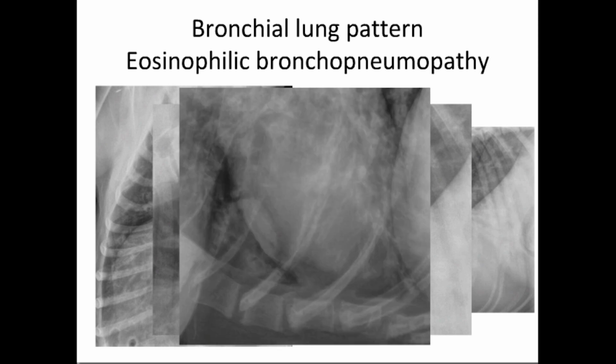This patient also, you may have noticed on the larger images, has additional pathology. We can see here a soft tissue nodule, and actually a couple more when we look a little bit closer. And this shows how in the real world most patients don't have just one lung pattern present, which is why starting with the lung pattern is not necessarily the most helpful way of going about prioritizing your differentials.